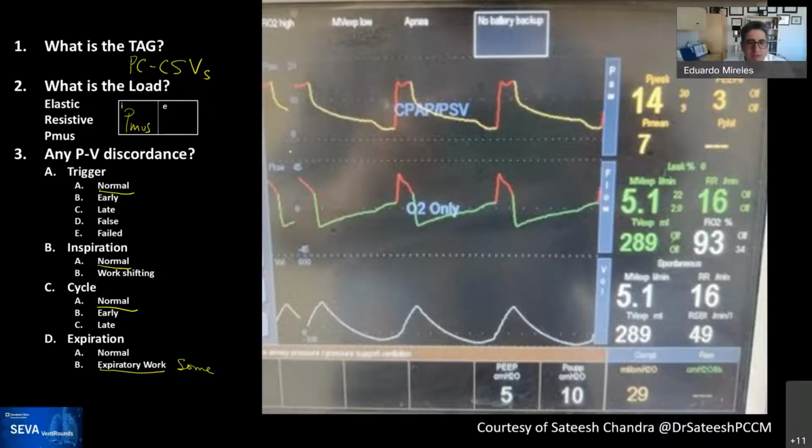Very good, Steve. And that's why I picked this one when Satish sent it to me. I thought that it was a good testing ground for us. He was playing with the ventilator, actually walked in, and then he modified a setting. So let's start from the beginning. I think that you read this very nicely.